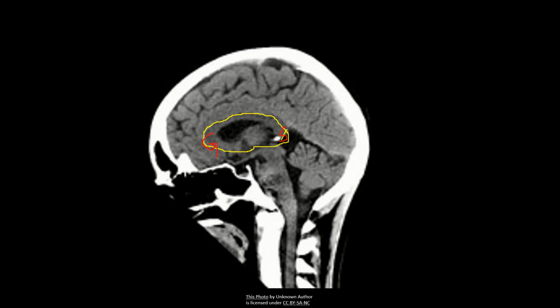It is vital that you look at this area because tumors from one side of the hemisphere usually pass over to the opposing side through this corpus callosum. Elsewhere, the falx cerebri acts as a relative barrier to the spread.